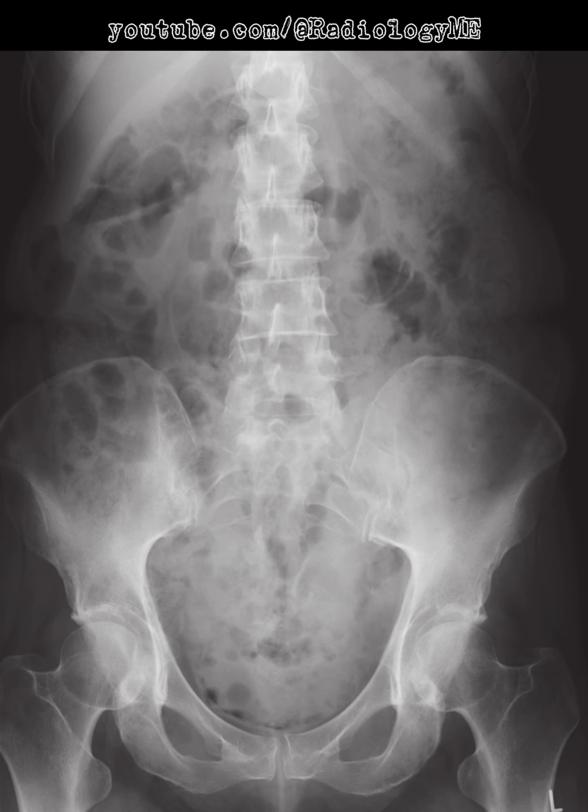A CT scan would provide further clarity and is considered the most sensitive and specific imaging modality for diagnosing intramural bladder gas. Considering the clinical context and imaging findings, emphysematous cystitis becomes the most probable diagnosis. The presence of intramural bladder gas in a diabetic patient with or without systemic symptoms would prompt urgent discussion with the referring team. Immediate management is crucial due to the risk of rapid progression to sepsis.